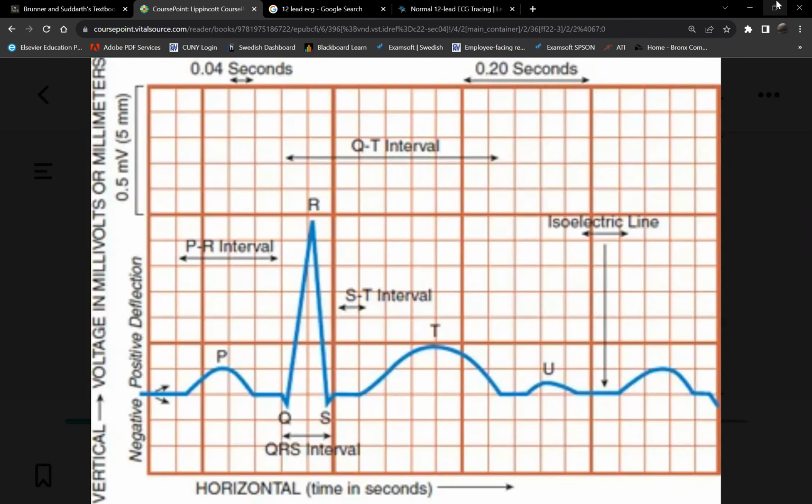However, if that happened, then the QRS and the P wave will actually happen at the same time, right? If you think about it. But is that what happened? No. There's a moment here before the ventricles contracted. So therefore, is the electrical current really instantaneous? It was not. So this is the delay which is made possible by the AV node.